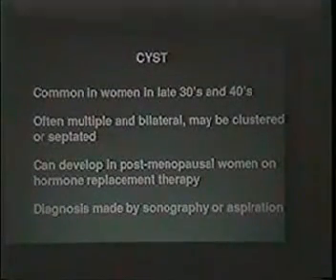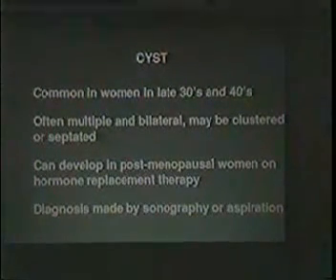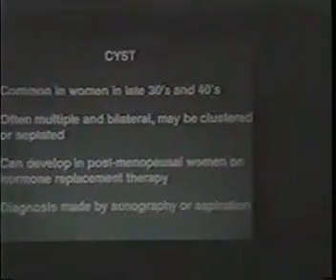And the diagnosis is not made on the mammogram. The diagnosis is made by doing a sonogram or doing an aspiration. Now, cysts, of course, are filled with fluid, so they are water density, and they look the same as other water density masses do on a mammogram.